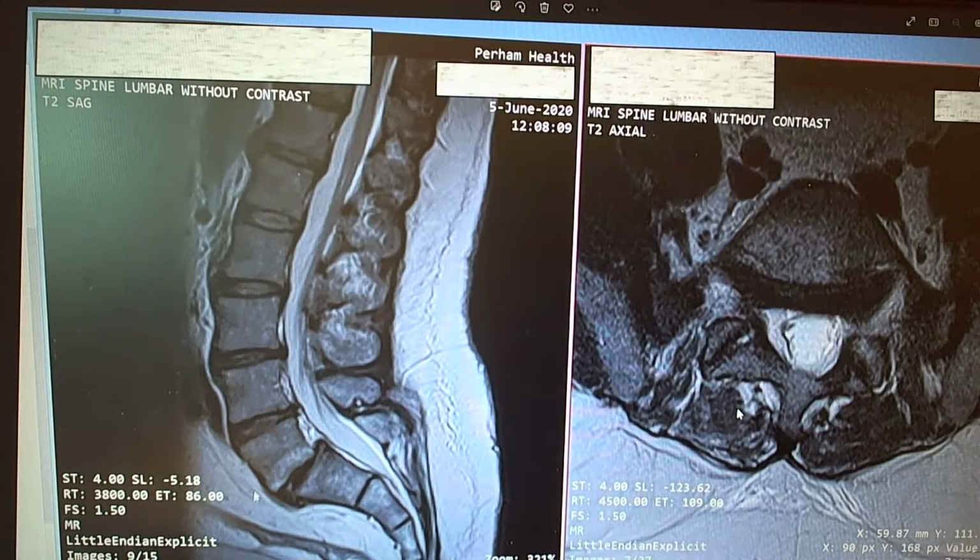So, what is this disease called? The L5 on S1 is shifting forward. What is this disease called? Do you know the name of the disease where the bones are not aligned? Anterolisthesis, perfect. Or spondylolisthesis. You can call it anterolisthesis or retrolisthesis, or you can call it spondylolisthesis.